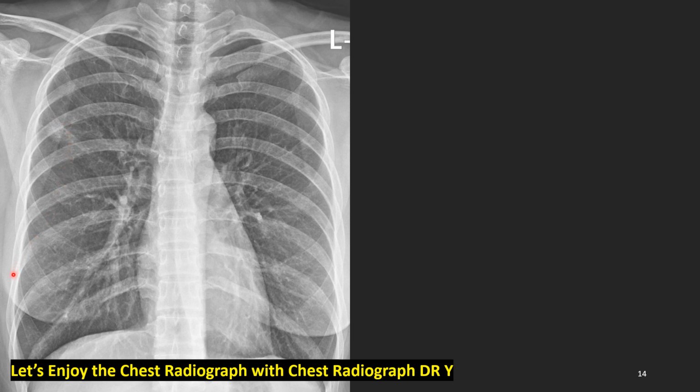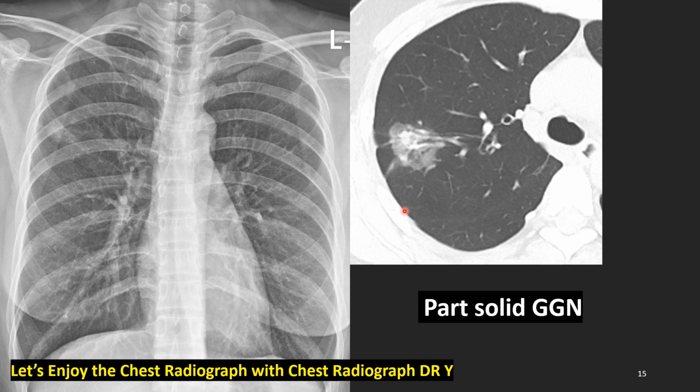Okay, this woman looks relatively young, a woman with a right upper lobe ground glass opacity. This is thin section CT, a CAT scan. What do we see? A bigger and denser subsolid nodule than the previous case, with the spiculation approaching the pleura, more aggressive looking, and the pure ground glass opacity area is even looking not so pure, and the central portion is denser, and we see an intratumoral air bronchogram here. Yes, this should be a more progressed form of part solid ground glass nodule, adenocarcinoma.